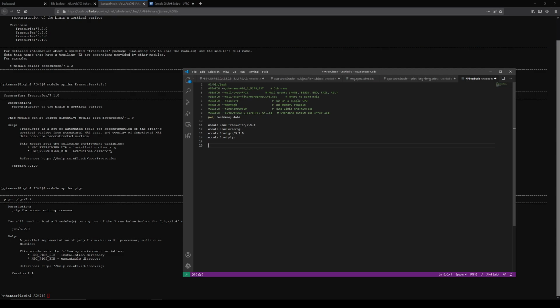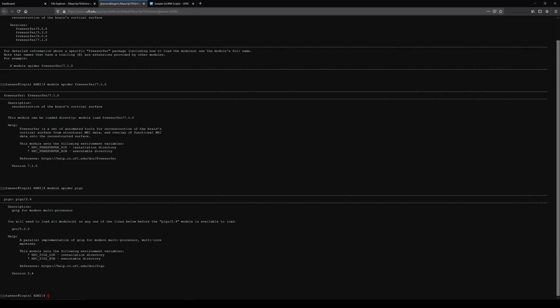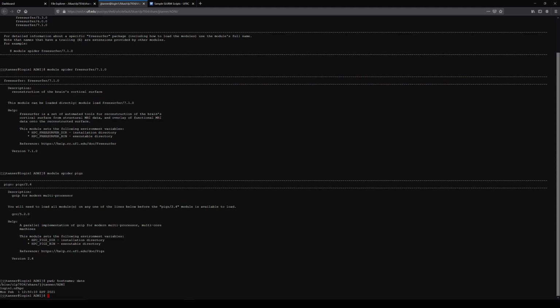So the first thing I'm going to do is change directories. So let's remember we're writing the script, so we can test this out all live. So I could test this first line, meaning I can copy this. We can put it in here. So I get the present working directory.